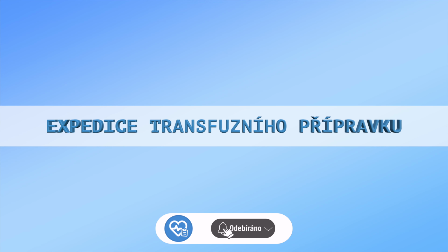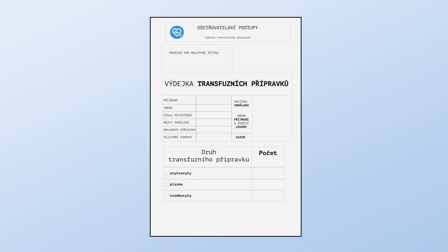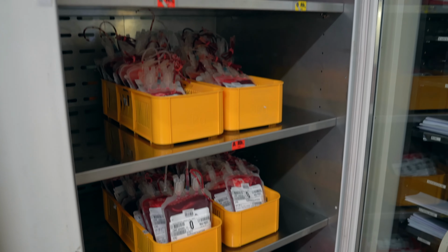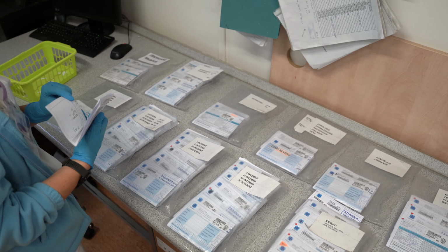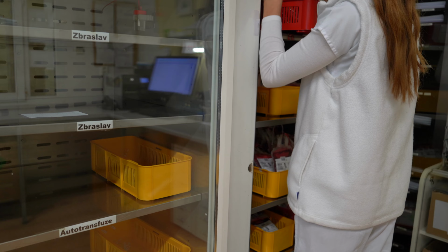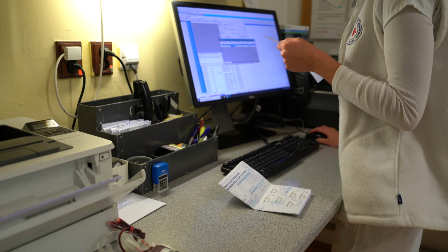Blood products are released from the blood bank based on a completed requisition form. It must contain complete patient ID, type and number of products requested, phone contact, the department stamp, the name, and the doctor's signature. Before release, the blood bank staff verifies appearance of the blood product, product number, blood group compatibility, test results, validity of compatibility testing, expiration date.